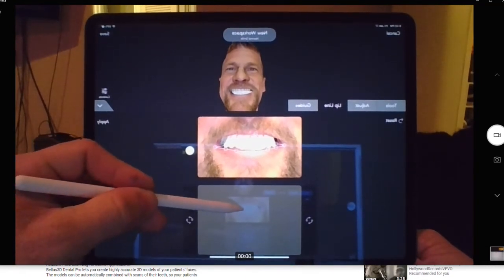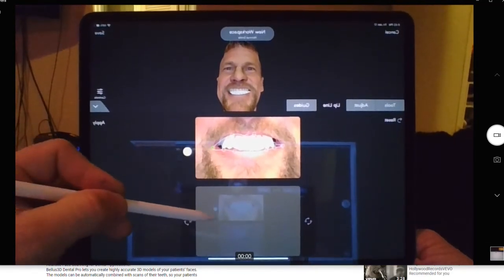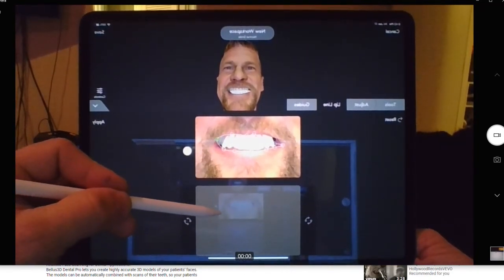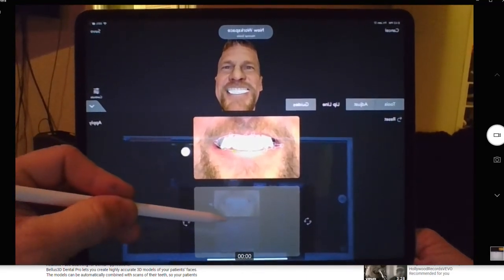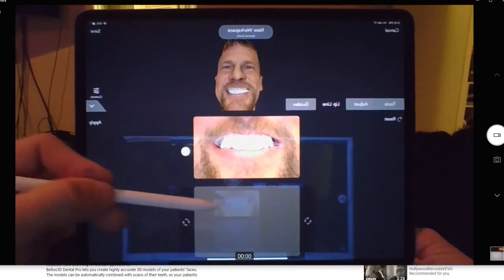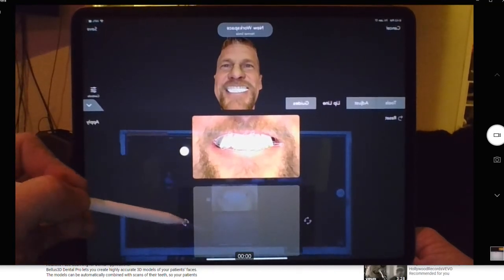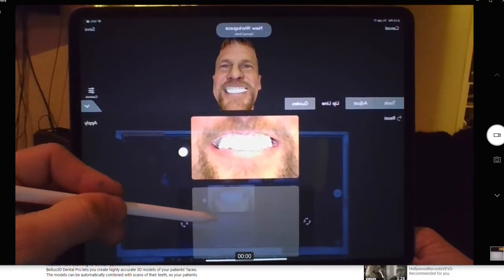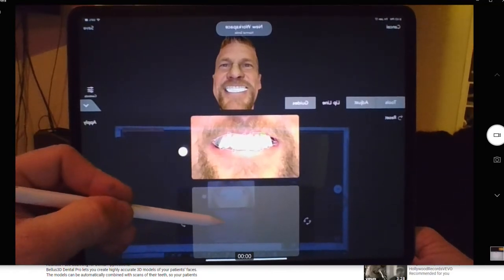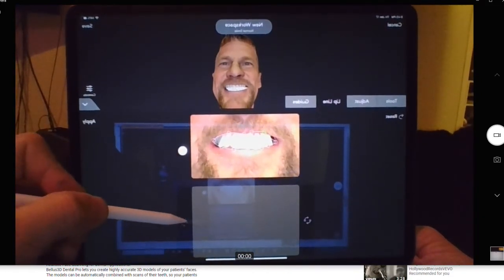And then the other thing that I was showing Rachel today is you want to try to make it symmetrical. So if the smile is not very symmetrical, then cheat and try to make it a little symmetrical. Because if their lip is higher on one side or lower, I think that's because the teeth in there are crooked. So we're planning on putting straighter teeth in there. So I plan on their lips being very symmetrical later. So just cheat and make it symmetrical now. So looks like my right side's a little bigger. I'm going to cheat. And I'm making a video. I'll get ready really fast.